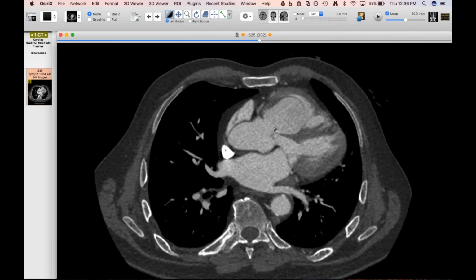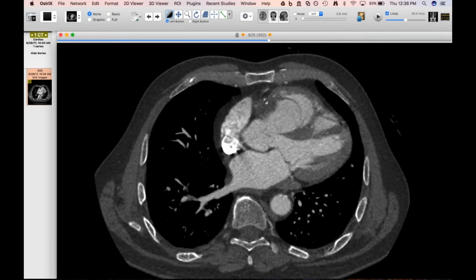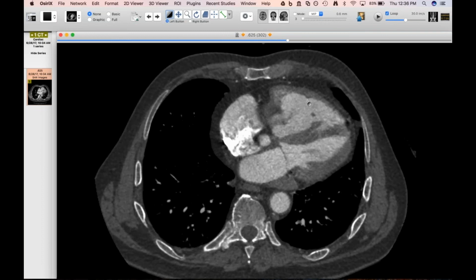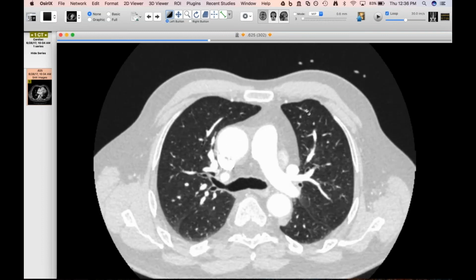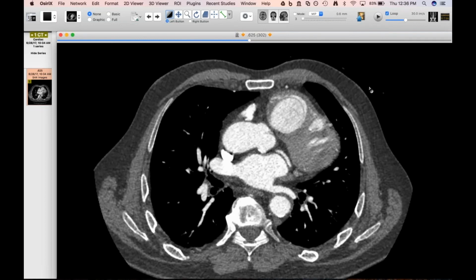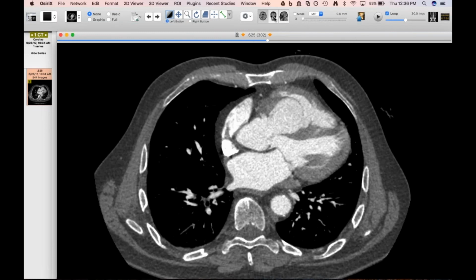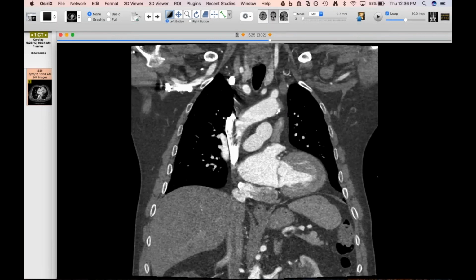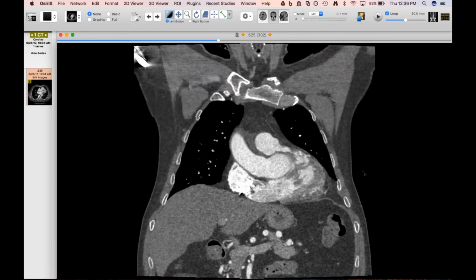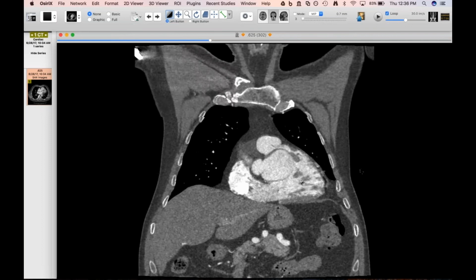And why slow flow. Do they have an independent reason for the RV wall thickening, or is there already? No, that's why I wonder if it's related. He doesn't have any underlying lung disease or any explanation for why he'd have pulmonary hypertension. I bet it's outflow tract obstruction from this. But I haven't had a chance to look at his echo yet because this was a VA patient. But yeah, this thing is enormous, and you can see how much of his RV outflow tract it's involving.